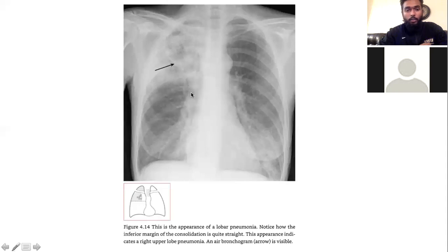Which lobe do you think it would be? It's the upper lobe, probably, right? If we count one, two, three, four, five, six, lateral border, hilum. That's good, because you see this right here would be the fissure, right? You see how it just ends bluntly there? That's because the fissure is containing it there, and that's another one. Now you see that tip I gave you to distinguish where the horizontal fissure is. You can see it because it goes from the hilum to the lateral or axillary border of the sixth rib.